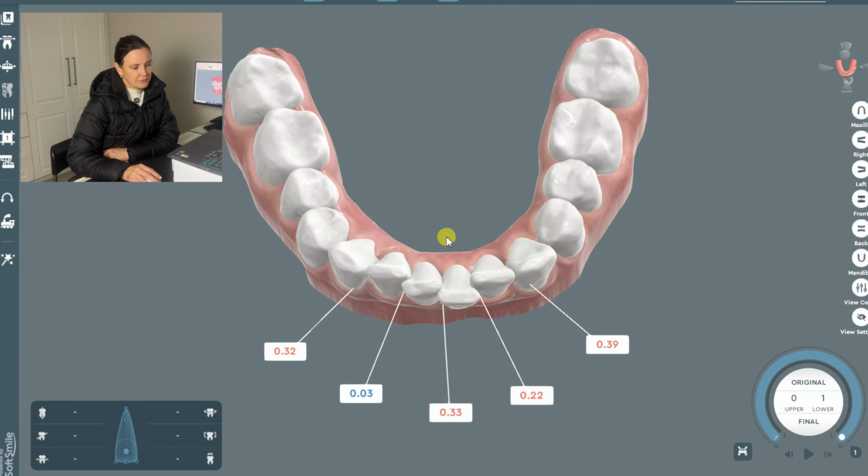Looking at the teeth, again, for stability, you want the teeth in the trough of bone. Actually not for stability, more for periodontal health, bone health, and for stability in the sense of occlusal forces. If you push these teeth forward, the angulation may become such that the teeth aren't going to be stable. They're going to relapse.